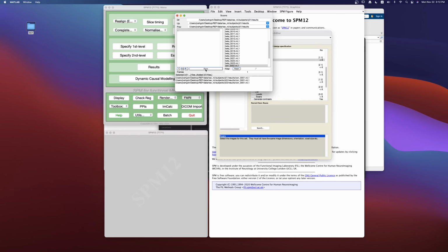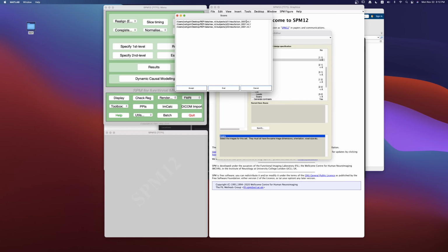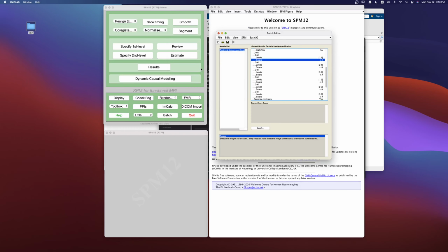And it'll come in handy later because, oh, sorry, it's not going to be con001. Remember, I want to start with P31, 32, and 33. So there's going to be con002. So con001 is not going to be used in my example here. All right, okay, so con002 for the P31 condition for young adults specified. I'm going to click done.